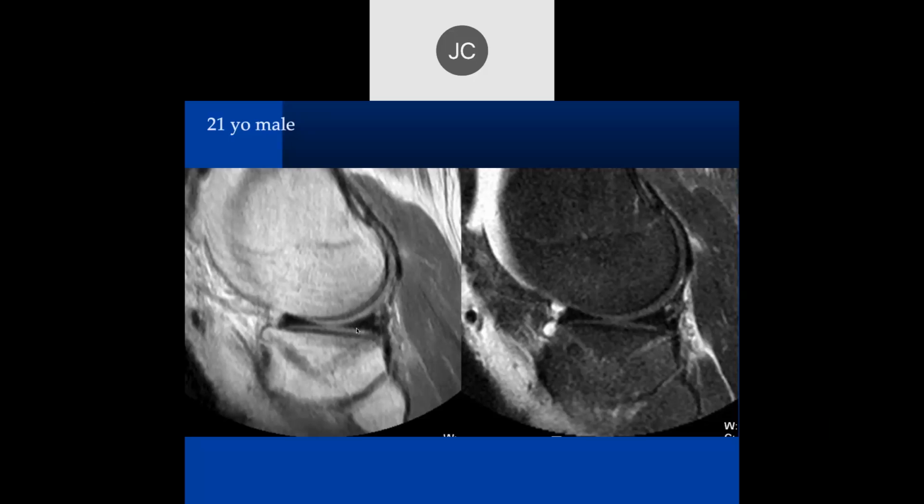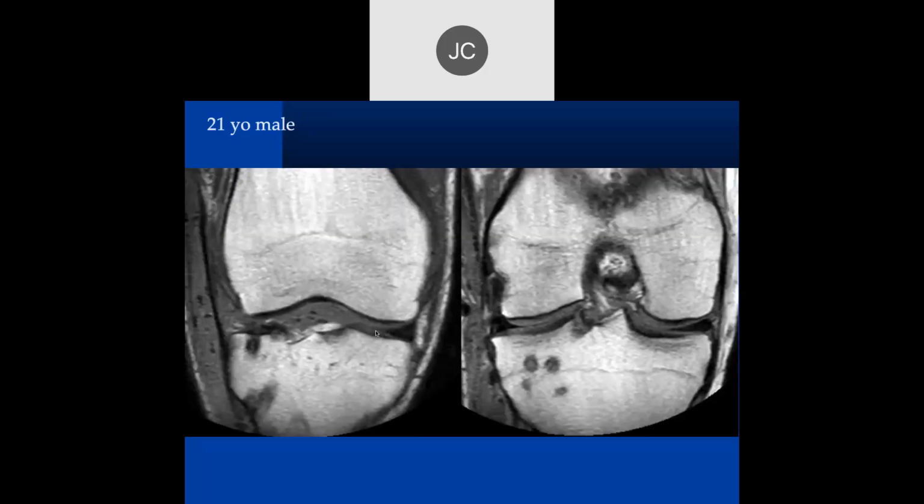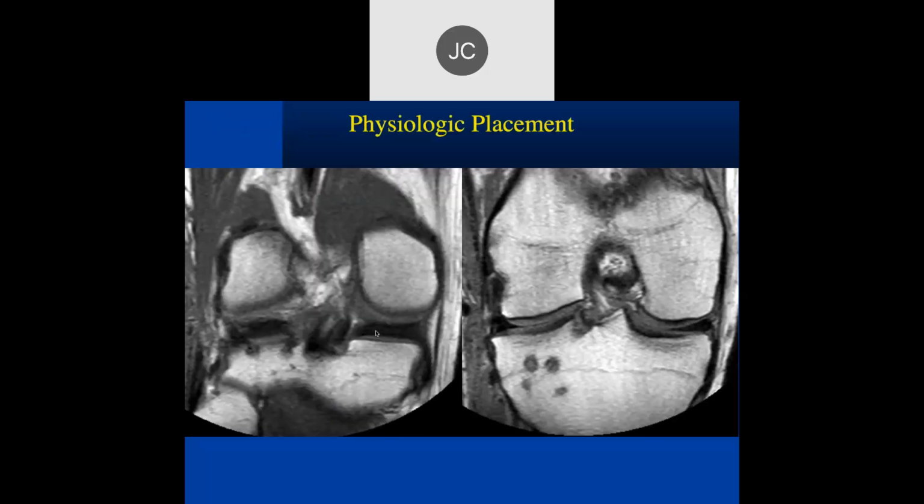In order to further stabilize the posterior horn, what a lot of people will do is, when they remove the native meniscus, if it's firmly attached, they'll leave the periphery of the native posterior horn back here, and they'll abut the graft onto that native posterior horn, which helps improve the stabilization of the posterior horn. So don't get fooled thinking that you've got a tear there, and you'll see examples of this when you read cases, because a lot of the ones now will have the residue of the posterior horn from the recipient.